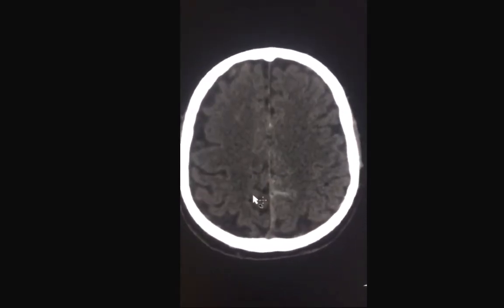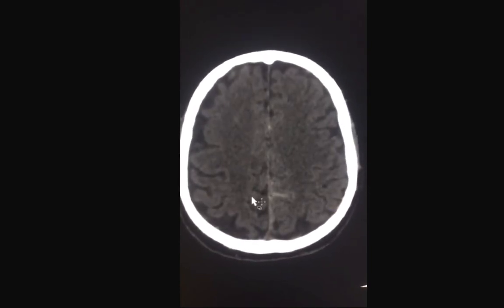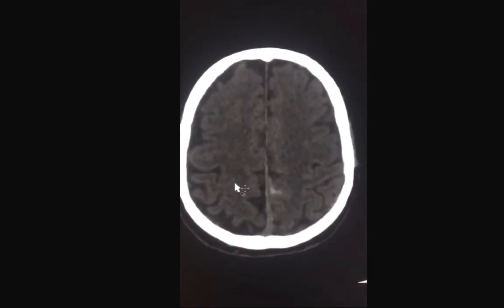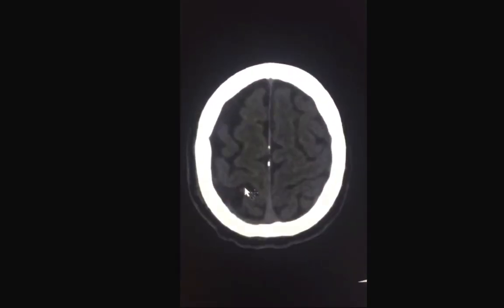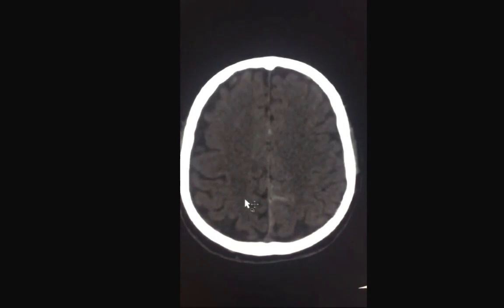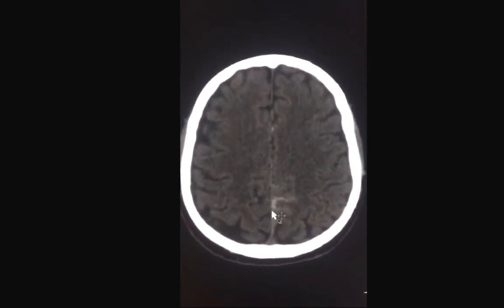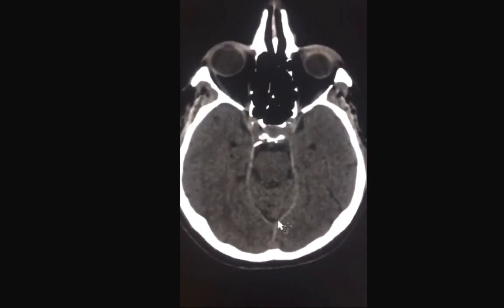More importantly, especially for residents reading the CT scan on call, is to be very careful when assessing cases of trauma. By that we mean that you have to look for very subtle signs of intracranial hemorrhage. First of all, make sure that your CSF spaces, the sulci, are symmetric bilaterally to exclude mass effect. Second thing, make sure that the falx is not thickened by bright material, especially in an asymmetric fashion, and that stands true for the tentorium.